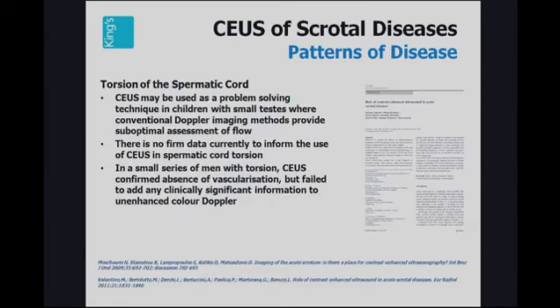Now, there are certain recommendations for the use of contrast-enhanced ultrasound in scrotal diseases, and I am going to demonstrate to you in the next few slides the data that is available and published in the European Federation's guidelines on the use of contrast in scrotal diseases. First of all, let's look at torsion of the spermatic cord.